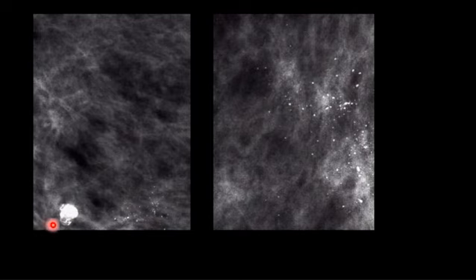Okay, just a high density material describing the bullet trajectory, and the largest collection of the shrapnels was photographed, and the density is much higher than that seen with breast calcification. You don't see breast calcific foci this dense, and if you notice, all of them are of the same density.